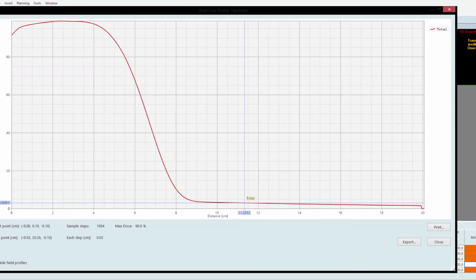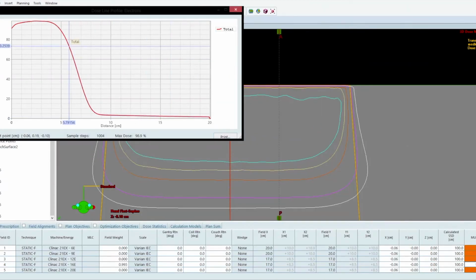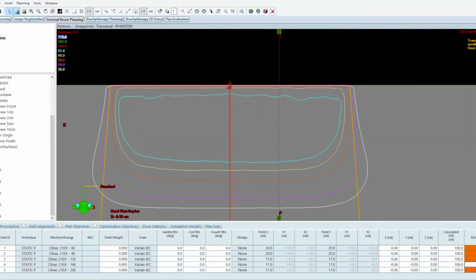So I've gone from 0.2 to 0.7 to 1.5 to 3 as I've increased my energy. If I look at isodose lines, again, my D90, my 90% prescription line is going to be my clinical coverage line unless the physician prescribes something different, like the 95% isodose line, which he or she may in this case because the skin dose is so high.